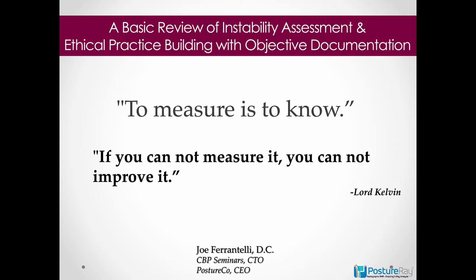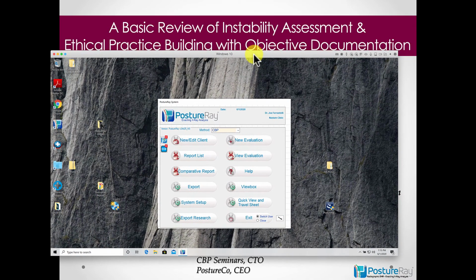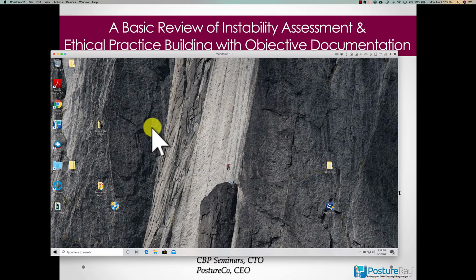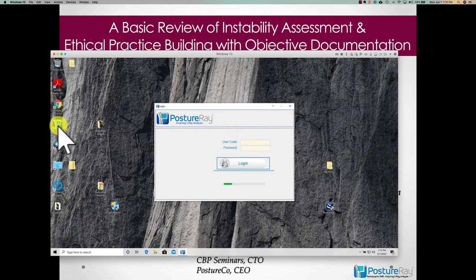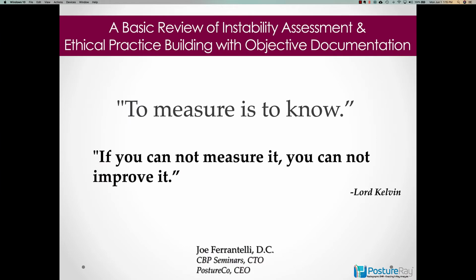So what I'm going to present is available in version 24/D25. You will know if you look at PostureRay, when you start up PostureRay, the version numbers are here, and once it loads, the version numbers are on the main screen as well, okay? So with that being said, let's go ahead and just review some of these basic tenets.